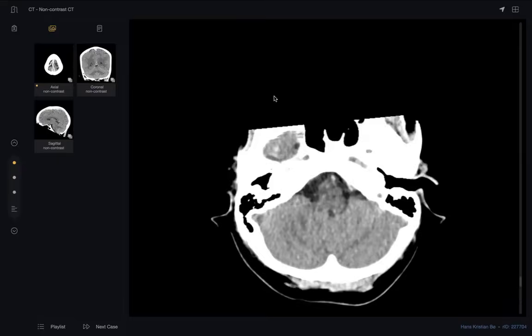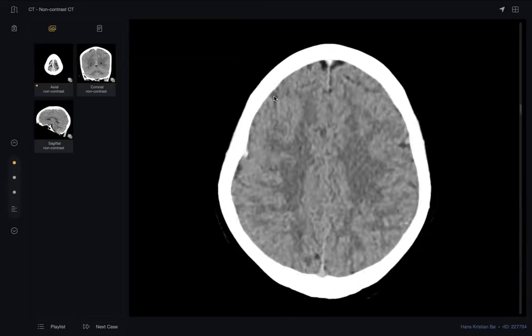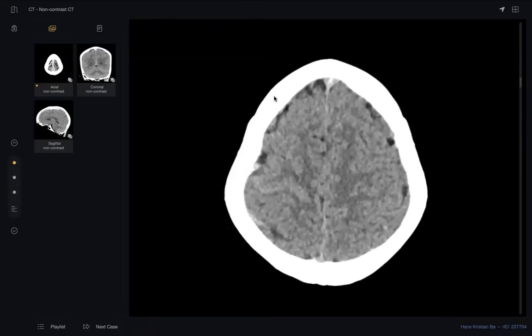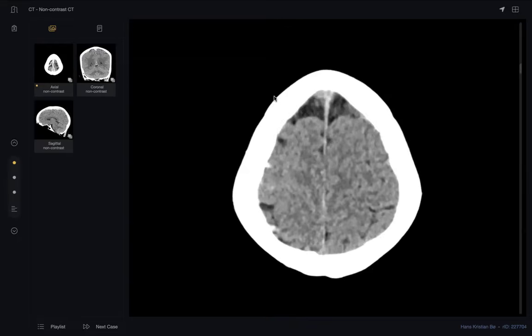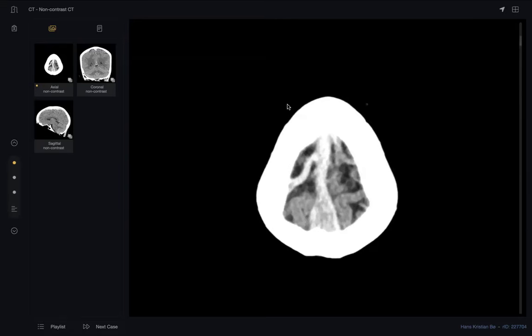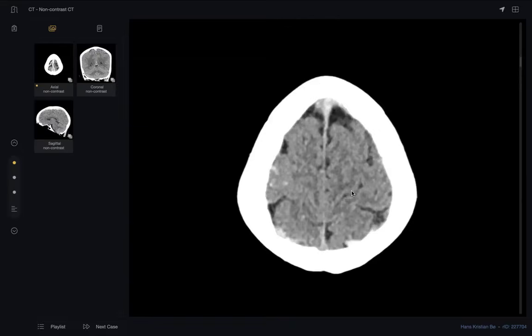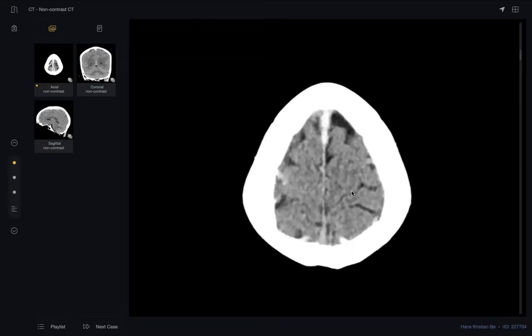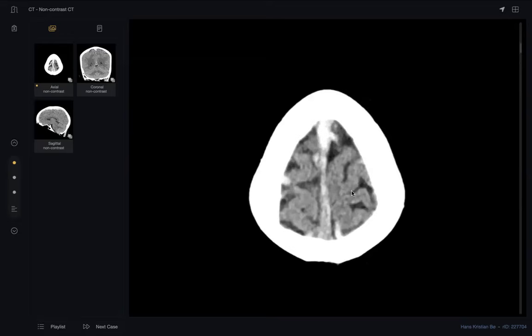You did very well when you asked me to scroll till the end. I stopped here until you gave me the request, so I go up. But here, the main finding is density in the superior sagittal sinus. This is very important, and a few surrounding cortical veins. After you mention this sign or description, you must follow it by your differential.